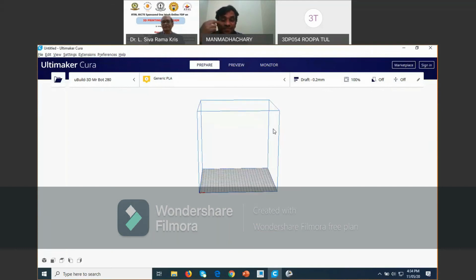Actually, we can extend further. We may change the orientation. How much is the build time? That is another exercise. We have bigger things, but I think there is not sufficient time. Within the given time, we have done what was possible. We have to change the orientation, calculate the time, change the infill percentage and the layer thickness. Everything you have to choose based on your requirements.